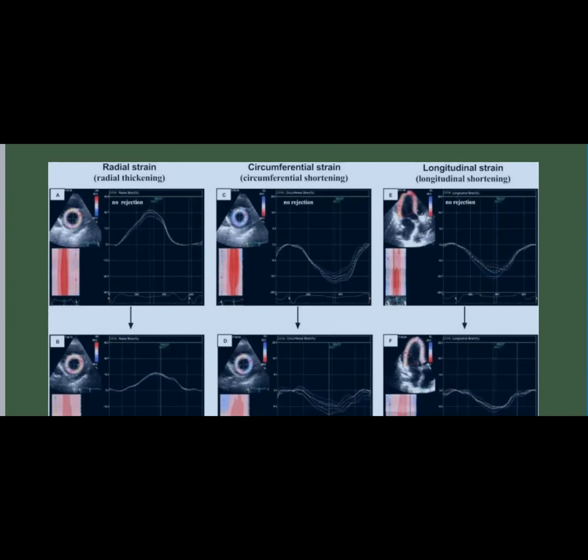So the ejection fraction remains the same, but the GLS goes down, meaning that we have an actual LV systolic dysfunction that is not predicted by the ejection fraction, which remains normal. So if the GLS is more sensitive and more accurate for LV systolic function, is it going to replace the ejection fraction? That's what we are expecting, okay?